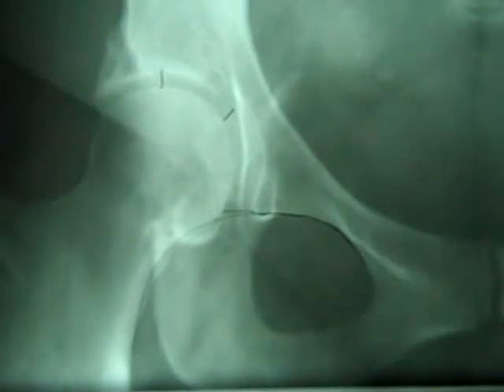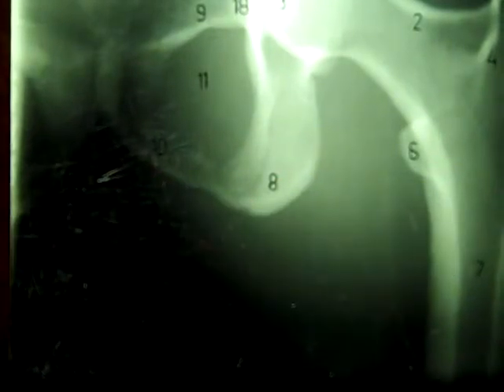For the last one on page 7, I'm actually going to switch out this film and use one that comes from the lab, because on this film I do not see enough of the shaft of the femur in order to do that. And so it is called femoral angle. And for femoral angle, the reason that I didn't use this film for the last two items is because you notice that this is actually, let me move out just a little bit. Nope, I will have to raise this up.